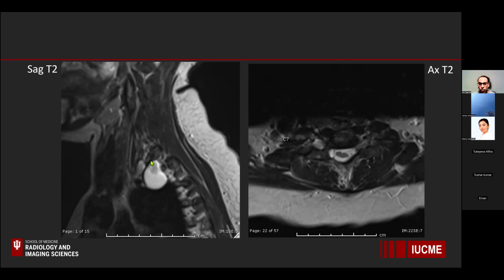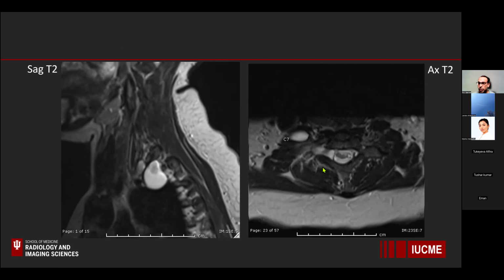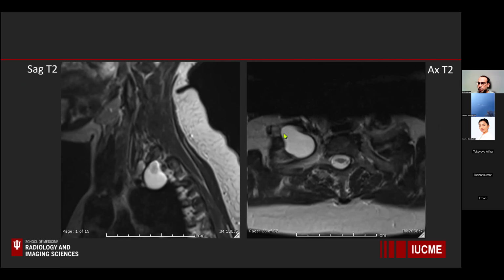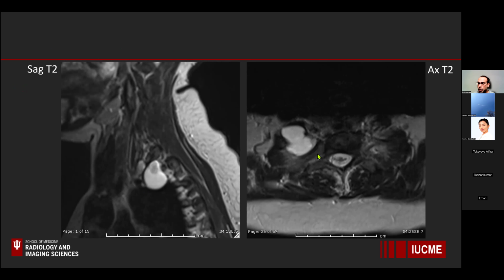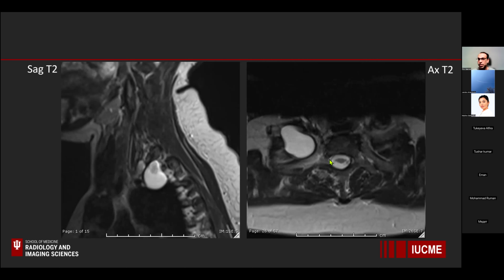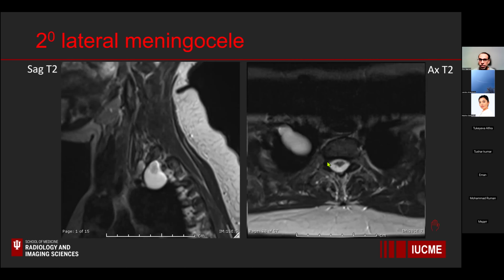in the hemithorax. We came across a cystic appearing lesion, and you can see on the right side of the screen as I scroll, there is a meningocele that extends into the hemithorax through the neuroforamina. So that's the third space phenomena causing the intracranial hypotension secondary to a lateral meningocele. Just a beautiful case of intracranial hypotension causing physiologic enlargement of the pituitary gland.